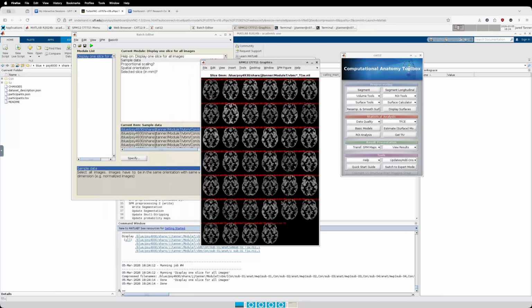And I guess it's not letting me make it larger, but what we can see is just one slice. But really what we're looking for is, does this look like roughly the same slice for everybody? So these are all the different brains. So all our 40 participants. We just want to make sure that we're seeing what looks like about the same structures.